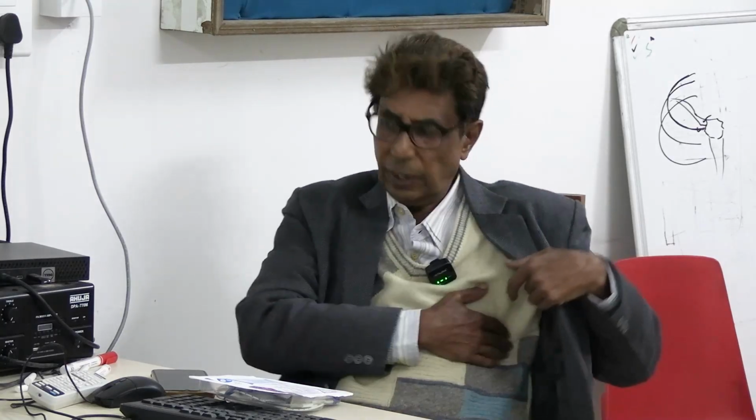Apex beat তো এই বাঁদিকে থাকবে। আমরা ইউজুয়ালি ইন্ট্রোডিউস করি ইন্টারনাল জুগুলার ভেইনের রাইট সাইডে, সেটা আসছে আমি পরে। Somebody says fifth, somebody says fourth intercostal space. It is the level of the tricuspid valve, by level of the right atrium.